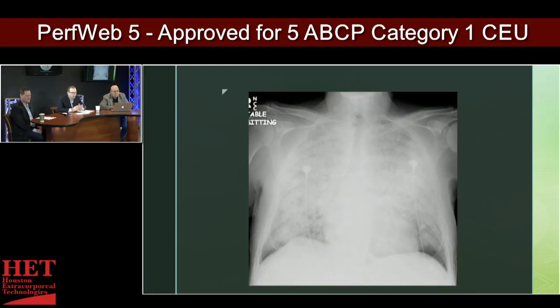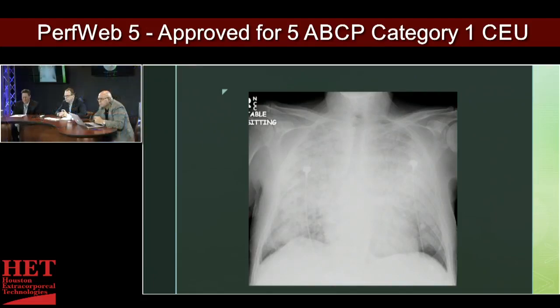So Patrick, when you look at this film, can you kind of just walk through what you see? I'll do my best. I see a lot of problems with the lungs on both sides. I see the placement of EKG leads. I can't see the heart much. I can see a little bit of the heart looks larger than normal. Is that correct? Mm-hmm. Okay. That's about what I see. That's why I'm here.